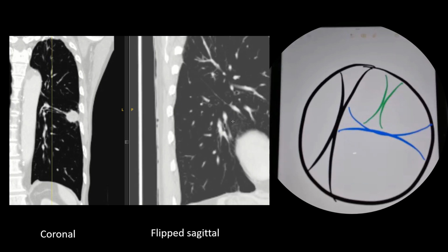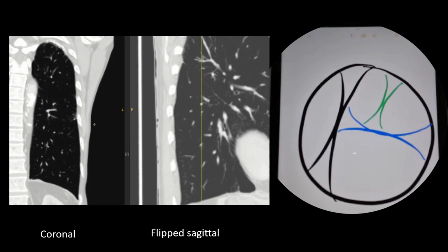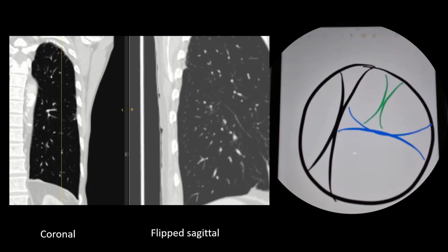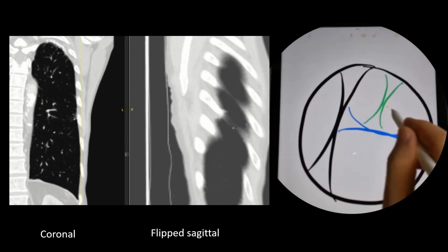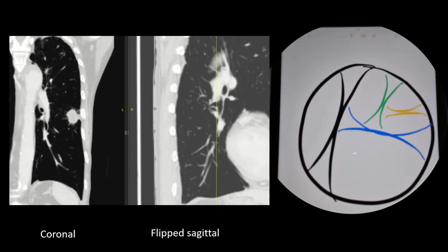Continue to play through the CT, we see that the right hole follows on. And looking at the sagittal, the right hole should lead to the nodule. There is a very small subtle split of the right hole up and down, but it's not easy to visualize and it doesn't quite matter because we know that both holes will lead to the nodule.